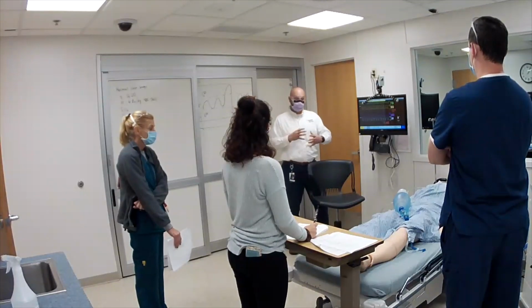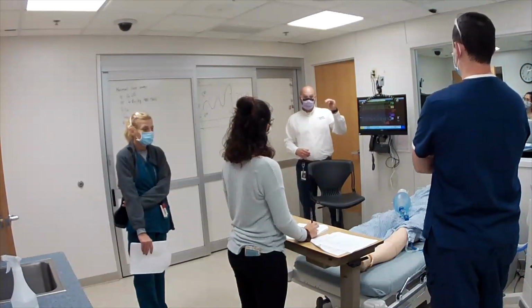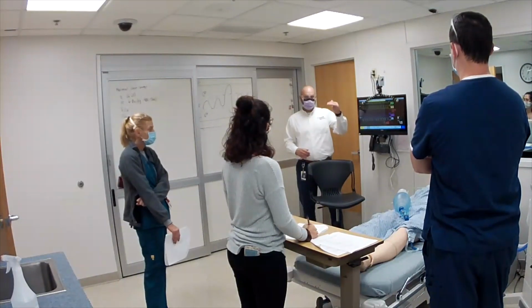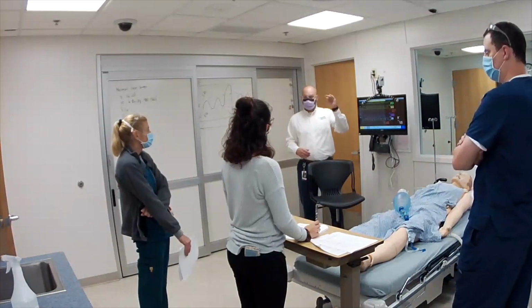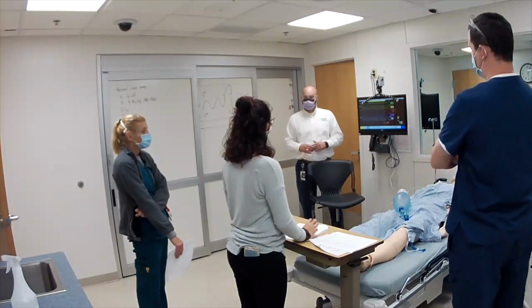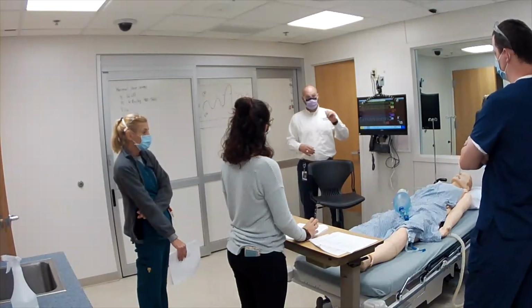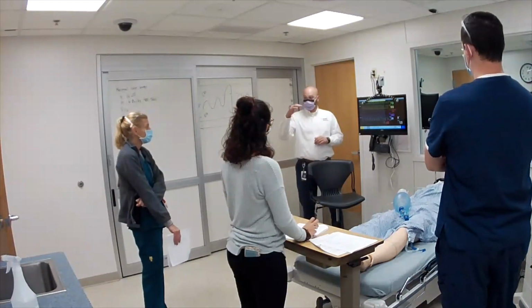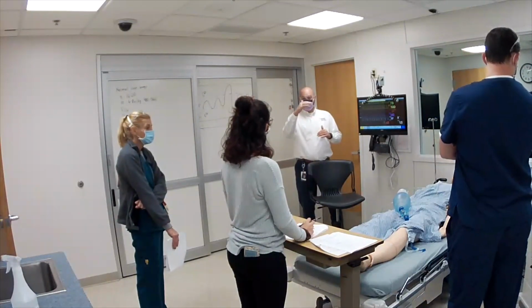When you hit that peak compliance number, as you start making changes, check your compliance, and as the compliance gets better, eventually it'll start to drop off again as you go over to the other side of where the best tidal volume was. So if we watch those compliance numbers, that's one good way to tweak the vent to get the best oxygenation or ventilation we can get out of a particular patient at a time, right? And I think this also is nice, Paige brought up trending those over days.